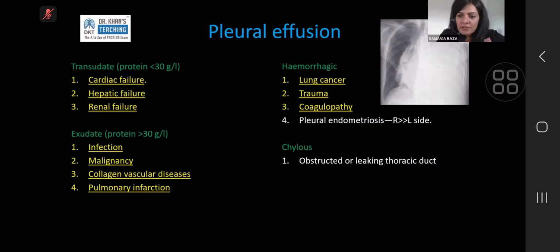In an 18-year-old, a university student, an immigrant, you can put primary TB higher than malignancy. The same patient, if they were 70 and a smoker with 80 pack-years, that's lung cancer unless proven otherwise. Sometimes you even do a CT and you can't see the primary. Sometimes the pleural effusion has cancer cells and you can't see the primary even on CT. But you absolutely need to recommend next steps when you look at an X-ray like that. So a large or moderate-sized pleural effusion without a cause, no trauma, no hemothorax, is suspicious for underlying cancer.